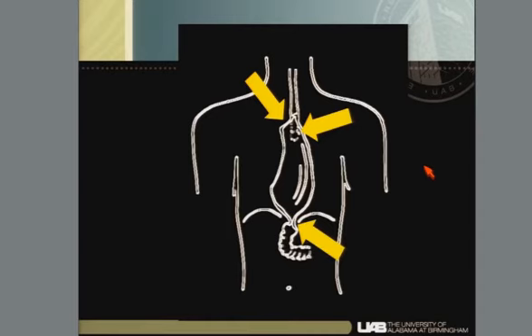You also need to interrogate the pylorus. Surgeons typically do a pyloromyotomy or a pyloroplasty, so we need to make sure that the stomach is emptying and there's no leak here. Our surgeons actually now inject Botox in the pylorus.